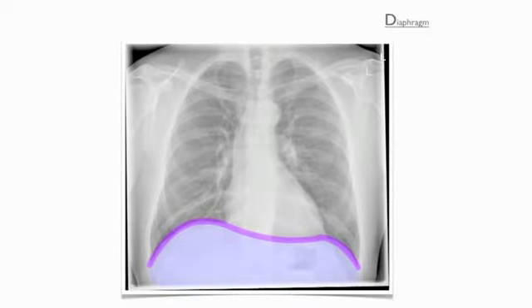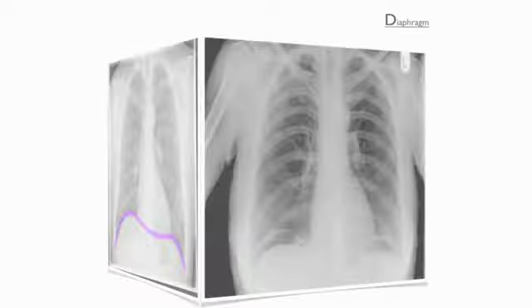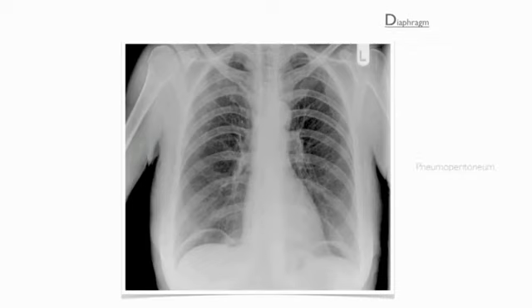Look below the diaphragm, at the gas bubble in the stomach, and for any free air beneath the diaphragm that suggests either a perforated stomach, bowel, or recent surgery.